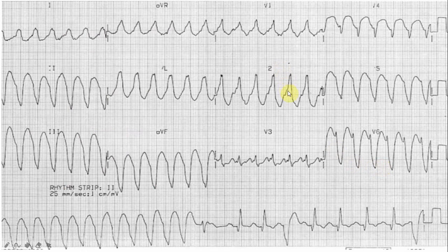So let's have a look at the real-life ECG. In this particular patient, if we look at Brugada criteria step 1, there is a positive deflection, positive and negative equal, and this is a negative deflection. So there is an R wave and there is an S wave. The first criterion we cannot apply, so we need to use the second criterion, which is the Brugada sign. If we look from the beginning of the R wave to the S wave, that is about 4 smaller squares, which is 160 milliseconds, more than 100 milliseconds.